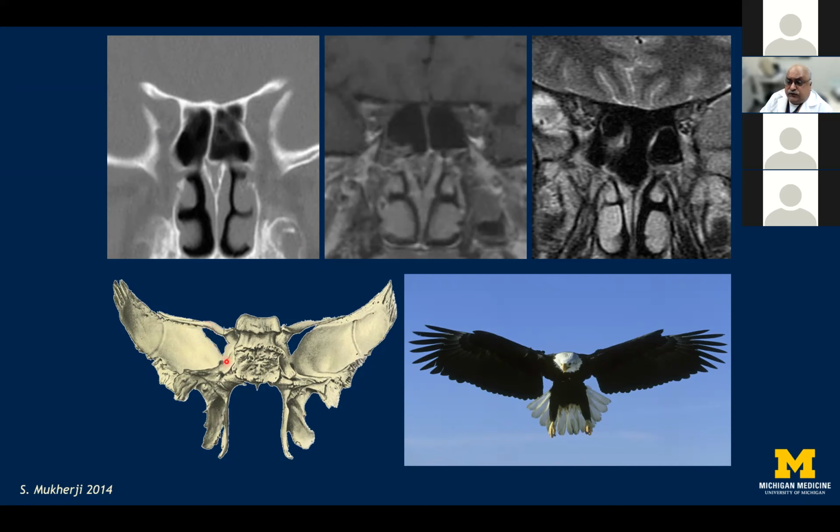The major features of the coronal aspect of looking at the anterior wall of the middle cranial fossa and the posterior wall of the anterior cranial fossa lies in recognizing the superior orbital fissure and the inferior orbital fissure, and the expected location of the pterygopalatine fossa in the coronal view.